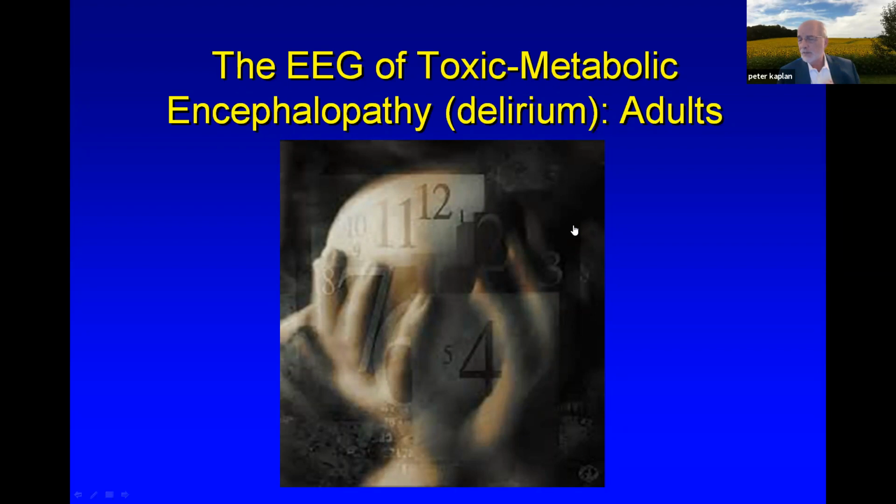The other point I would make is that triphasics to some people look like GPEDs, and they are subclassified as a variant of GPEDs. But the journal that's coming out in a week, the Red Journal of Clinical Neurophysiology, outlines how you can distinguish triphasic waves from GPEDs. And GPEDs that are frequent could be classified, as I said, as non-convulsive status, but triphasic waves really should never be treated, managed, or classified as non-convulsive status.